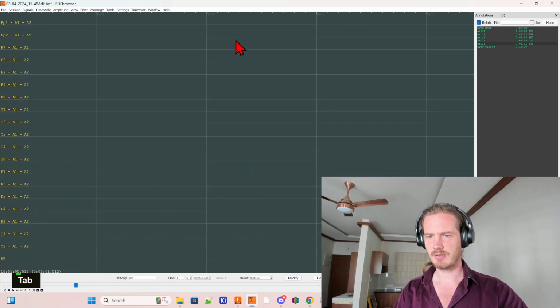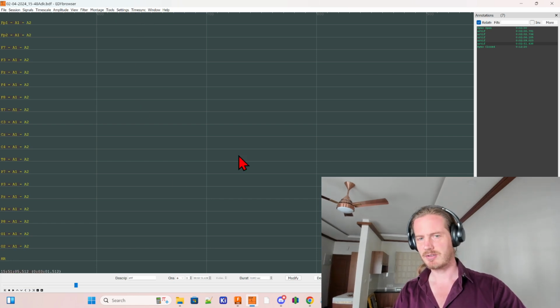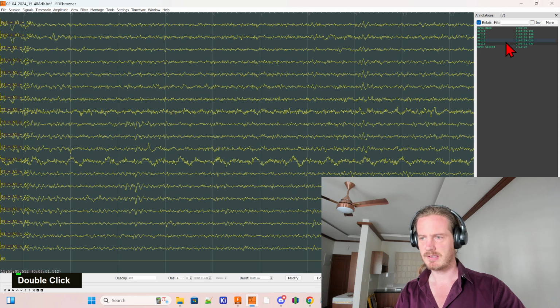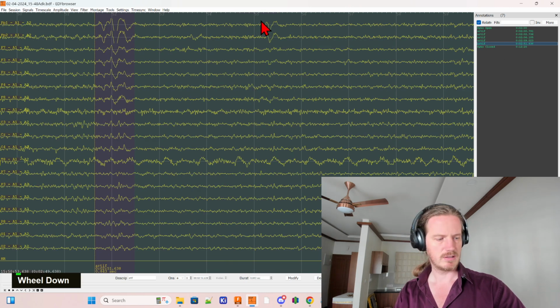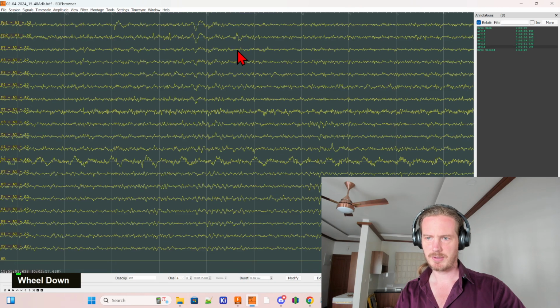Here's a very slight little, oh, I messed up. Instead of holding Shift down, I was holding Tab. And so now I've messed up my whole visualization. And the best way to get out of that is to go to montage, to load, and to just reload our period. And then now to navigate to where we were in the whole process, I just go to the last artifact that we annotated. And now I'm again having my finger on the Shift button and annotate that period.